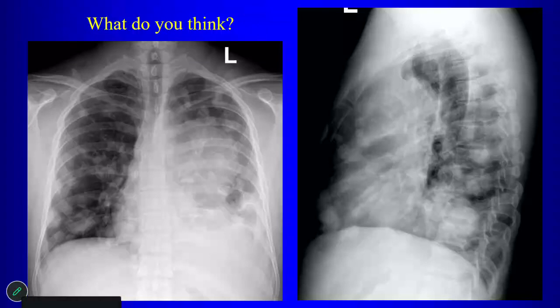You have multiple lung nodules. So do we think this person has benign disease or malignant disease? Malignant disease. Now, you're sitting in the reading room, you come across this chest x-ray, right? Tell me what differentials go through your mind. What's the first thing you might think about?